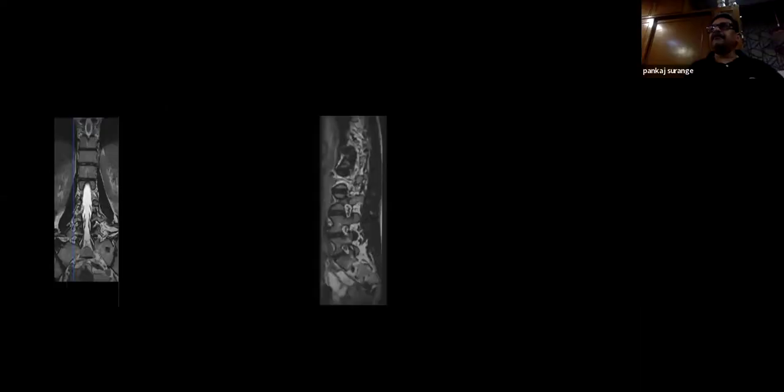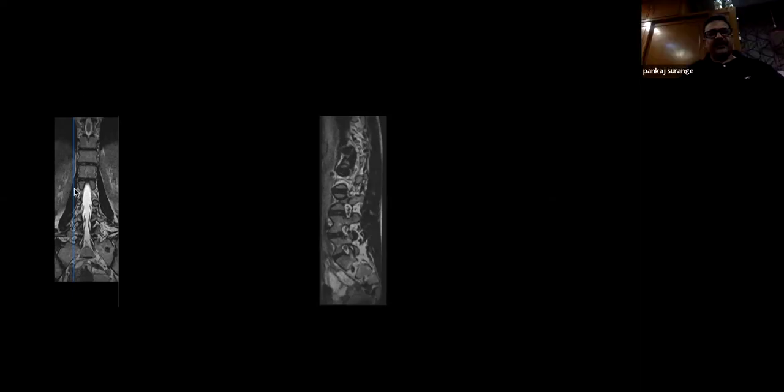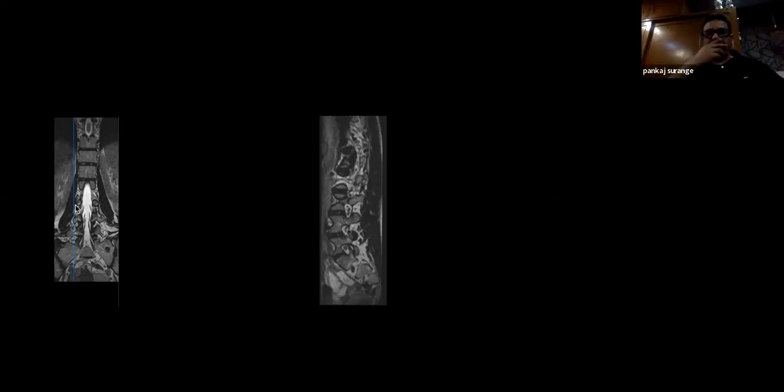The sagittal sections. What are sagittal sections? The sagittal sections, they are taken from right to left or left to right. Yes. So this is taken from the right to left. Okay. Usually it is right to left. On the screen, what you see now, we have multiple sections, right? In that, when you have several sections, always it's from the right to left.